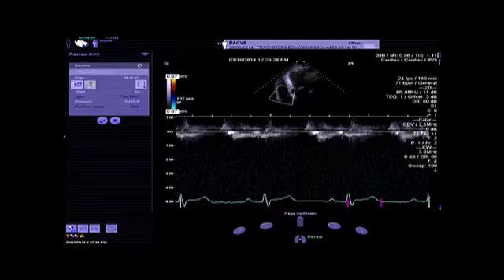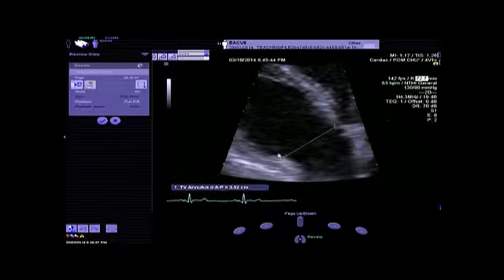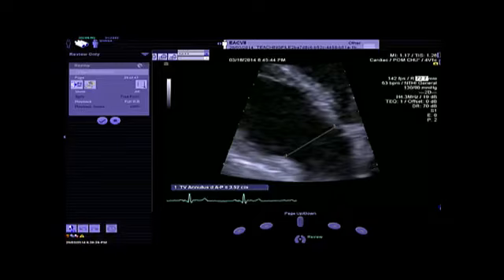So the last thing to do is to measure the tricuspid annulus diameter, and we will do this. And for sure, what is important to mention is that for this tricuspid annulus diameter, whatever the degree of regurgitation, when it is greater than 40 millimeter or greater than 21 per meter square, this is a class 2A indication of tricuspid valve repair when there is a surgery of the mitral valve. So this brings me to the end of my presentation.